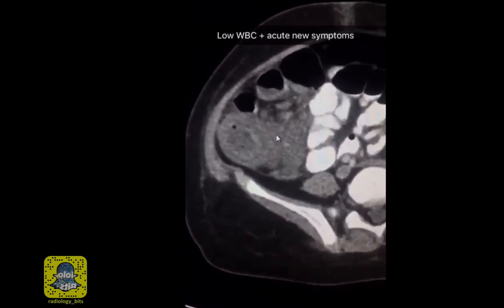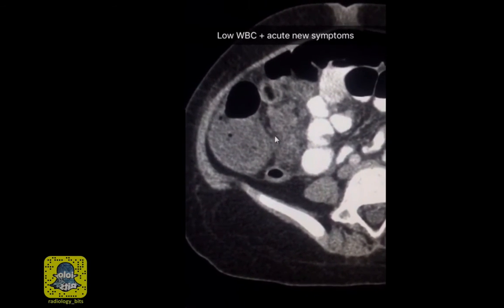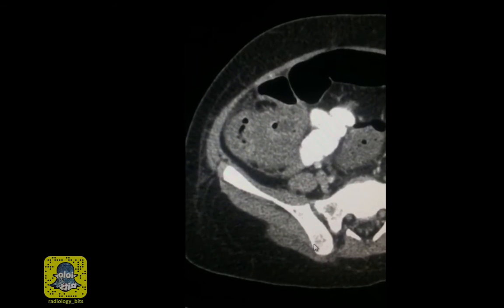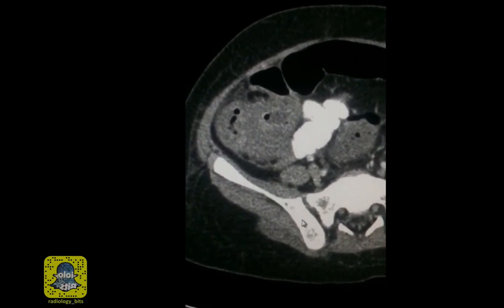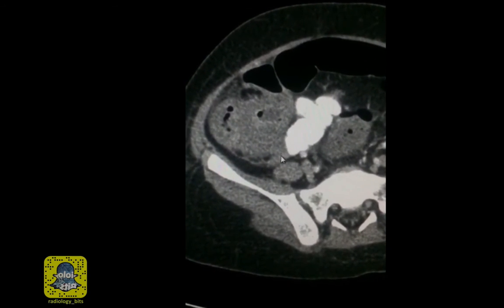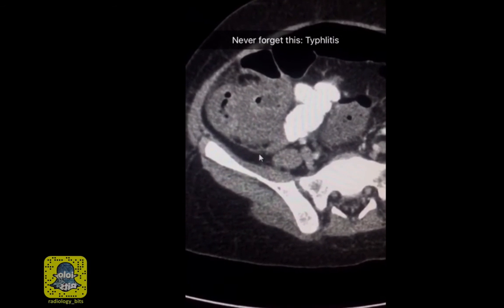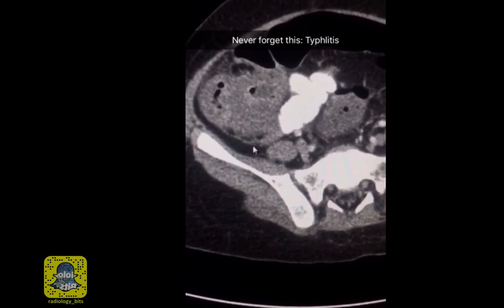When we did that, we discovered that the patient is extremely neutropenic after chemotherapy, and has fever, tenderness, and abdominal pain. The imaging features and the clinical scenario are consistent with acute inflammatory changes. And this condition is called neutropenic colitis, or more famously, typhlitis.